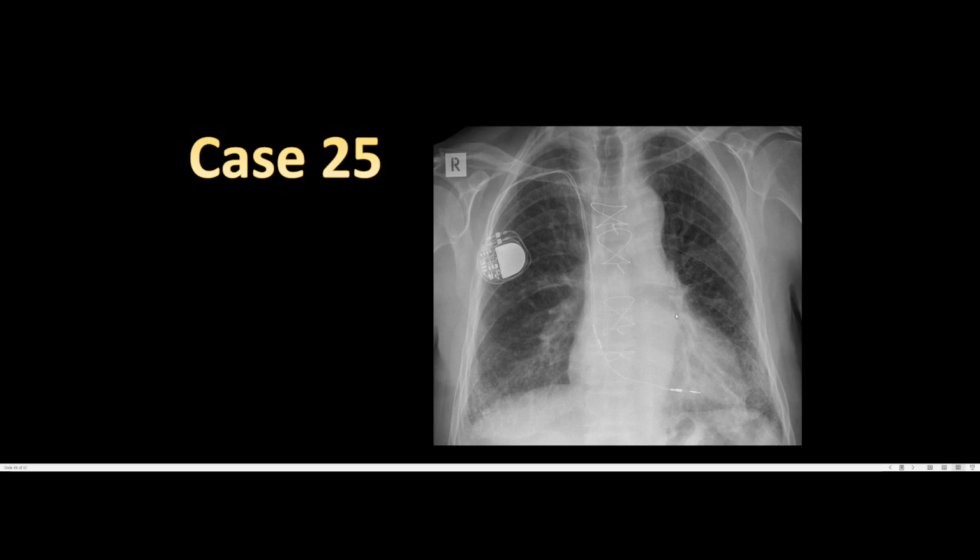And also sometimes you notice widening of the mediastinum. So you can see the mediastinum here, it's slightly widened, especially involving the descending aorta or within the aortic knob. So there's widening of the mediastinum, and that can mean a whole bunch of things. Again, maybe if I told you that a patient has severe chest pain radiating to the back, aortic dissection, for example, but oftentimes when you have mediastinum widening that is focal, or let's say diffuse, it might suggest bleeding, it might suggest fluid overload, whatever the case might be.